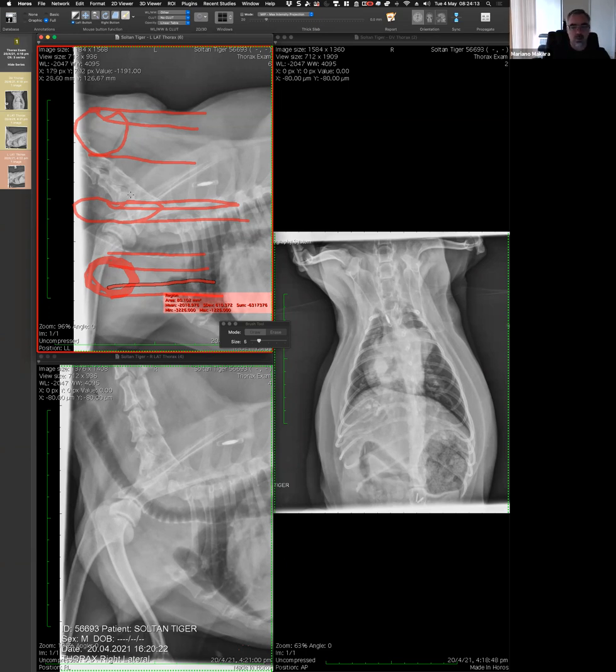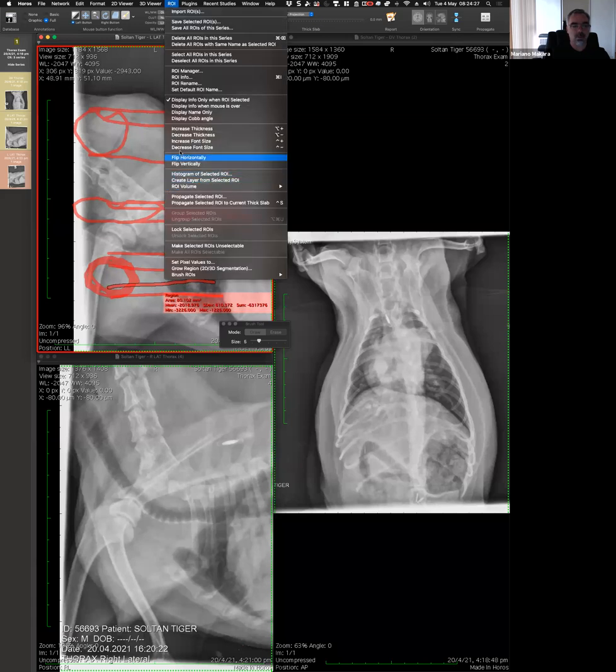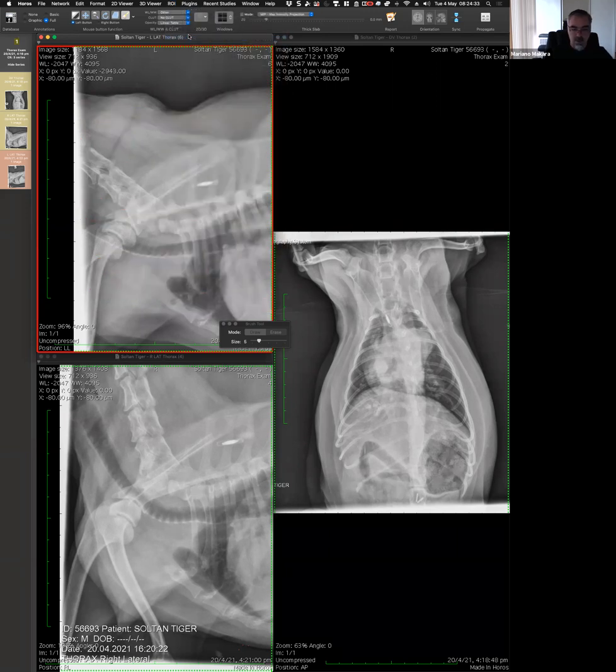So I agree with you that we need to take a close look in a dyspneic dog as much as we can. In this case, I see that it looks like a narrowing. I don't think it's a real narrowing. I think it's just the membrane. Okay. Hopefully you agree with me. Hope we're going to delete. Okay. Anything else?